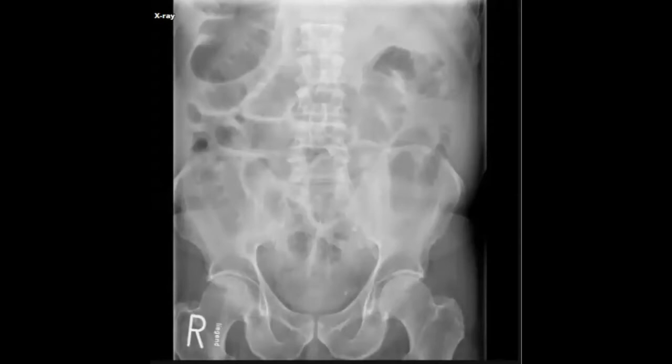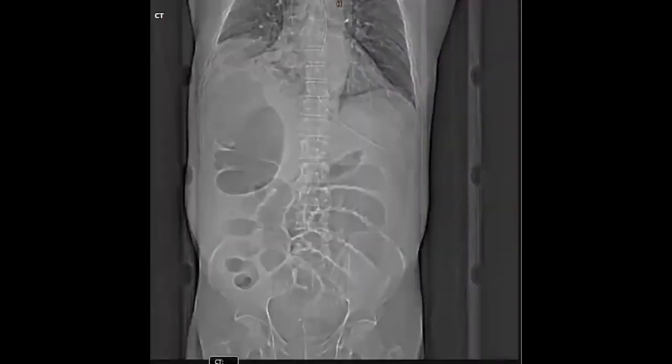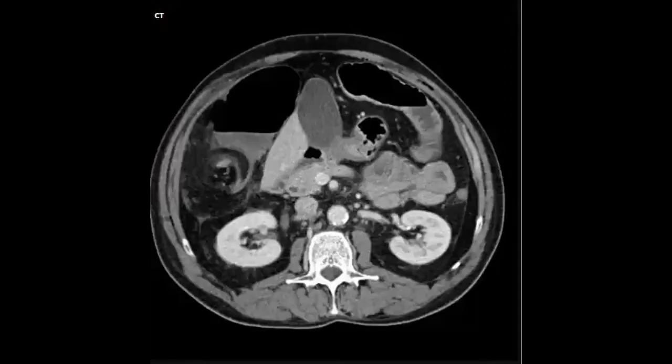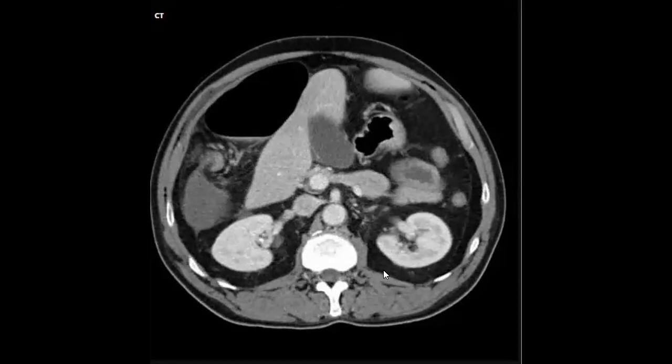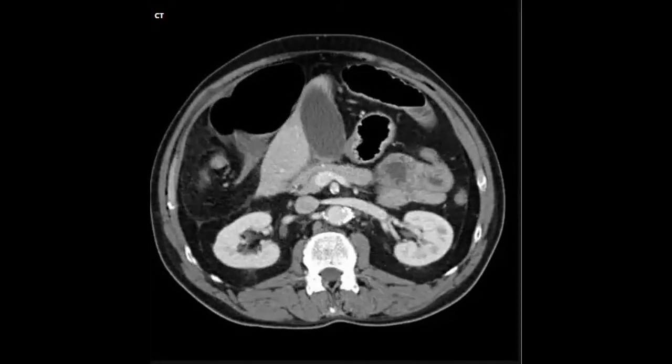So there is probably small bowel obstruction, or you can say small bowel dilatation, and search for the obstructive agent. If this is mechanical or ischemic or inflammatory or a type of closed loop obstruction or whatever. But at least you can check for the cause. You will go to CT and what do you think about the CT?